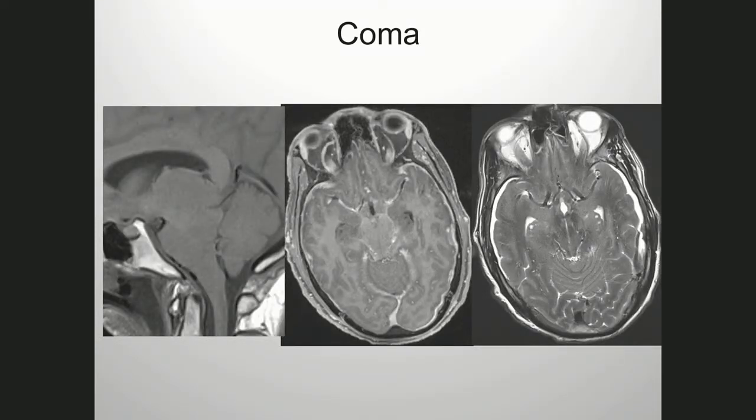This is a different patient and was altered and subsequently in a coma. And here you see the full-fledged brain sagging and descent of the brain structures, the mammillary bodies, the tectum, tegmentum. It's one unrecognizable mass that is at the level of the brainstem. You see the pons is enlarged and deformed. The cerebellar tonsil is not very much descended. However, the optic chiasm is quite abnormal. It's flattened and drooping back.